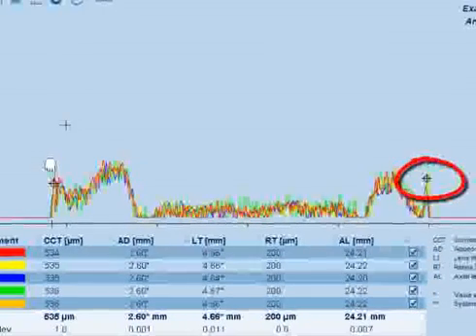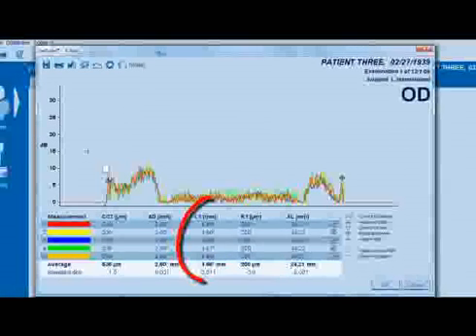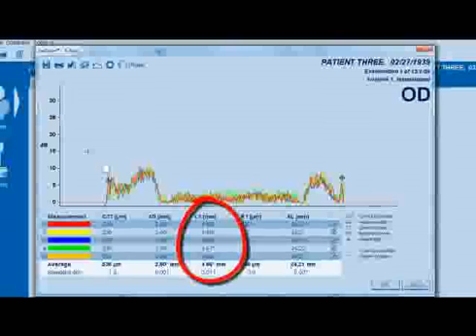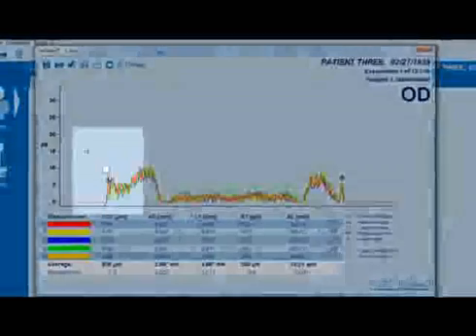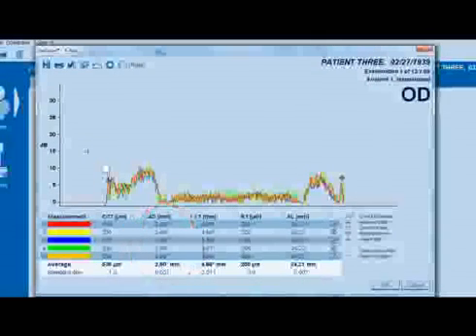To move the posterior lens gate, simply follow the aforementioned instructions. As the gates are adjusted, an asterisk will appear next to the lens thickness measurement or next to the area that is being manipulated. If the anterior lens thickness gate is adjusted, this will also modify the aqueous depth measurement.